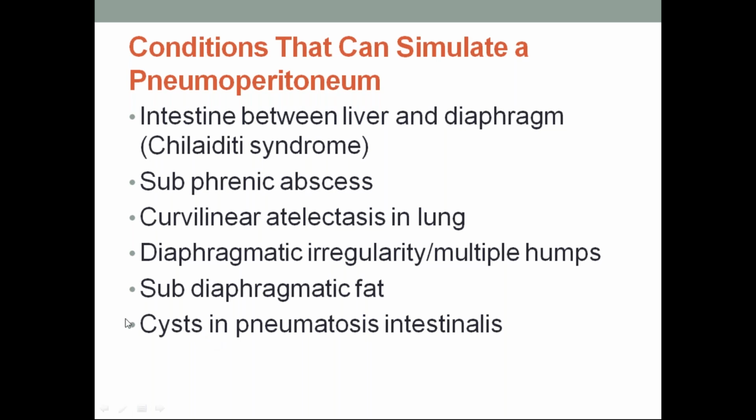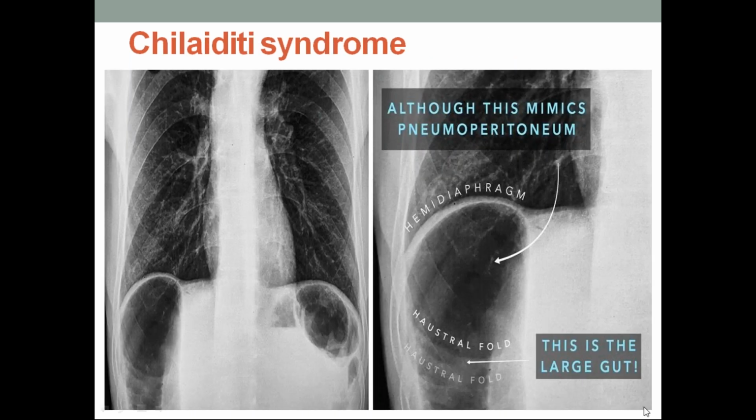Normally during infections, the cysts will be there and they will rupture, and after that sometimes perforation occurs, sometimes it won't. If cysts are there in the bowel wall, in pneumatosis intestinalis, it will mimic pneumoperitoneum. And this is the most important one for your needs also, and you can see the air under the right hemidiaphragm.